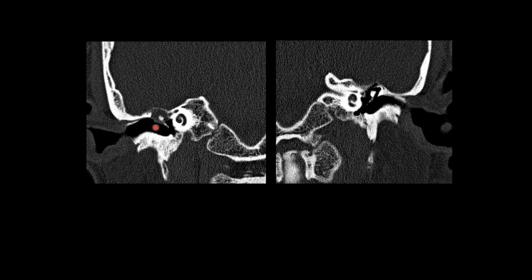On the abnormal right temporal bone, we see a soft tissue density within the mesotympanum surrounding the malleus and incus, and also filling the entire epitympanum of the right middle ear cavity. Now, a very important point here is you will see that triangular bony projection is missing. So this is suggestive of erosion of the scutum by this soft tissue density structure, which is a classical finding that we see in case of cholesteatoma.